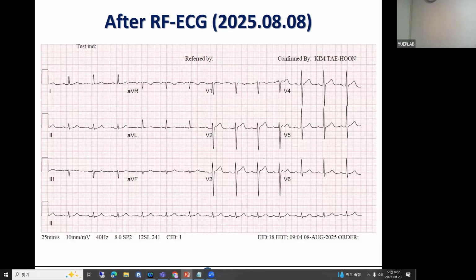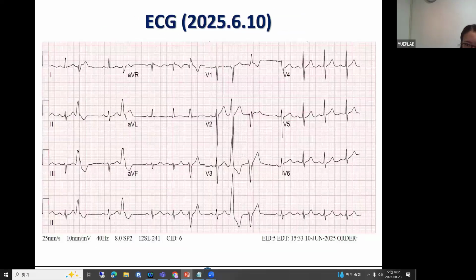I tried to provoke the third morphology PVC during the procedure, I mean the RBBB pattern, but it never appeared. Yeah, I think it's a triggered activity of the conduction system. But is it possible that it is a subtle mid-myocardial location, just having a more dominant exit to the right and then one sort of to the left side?